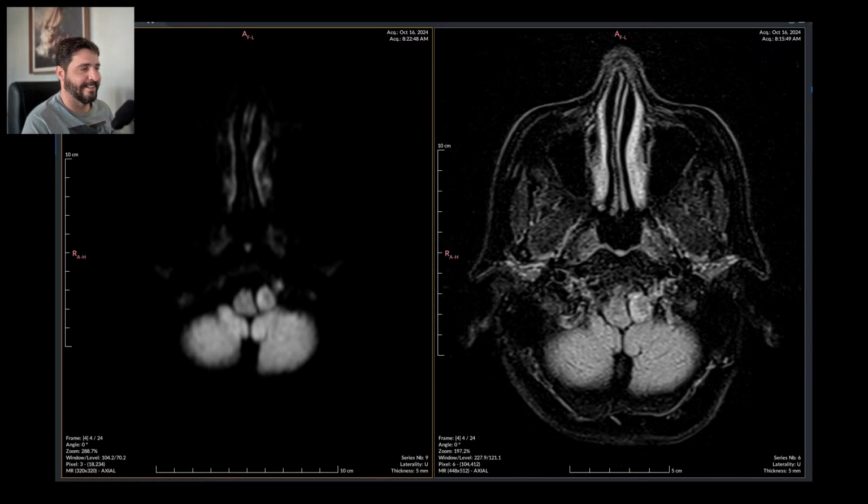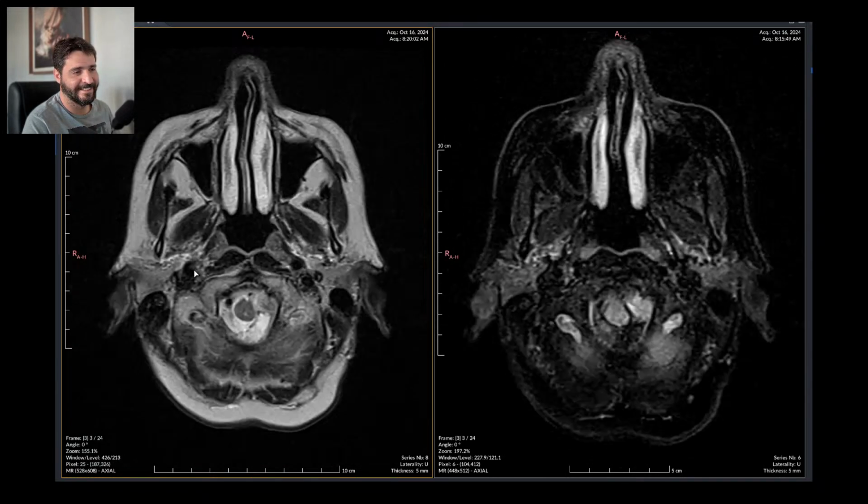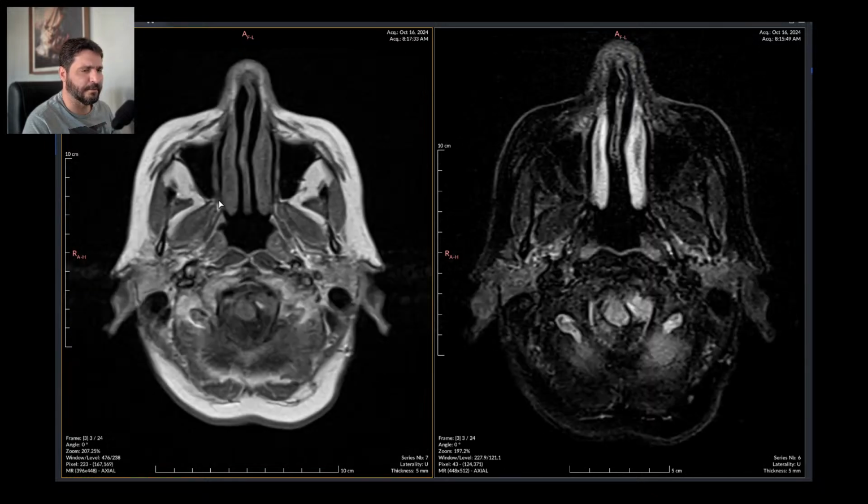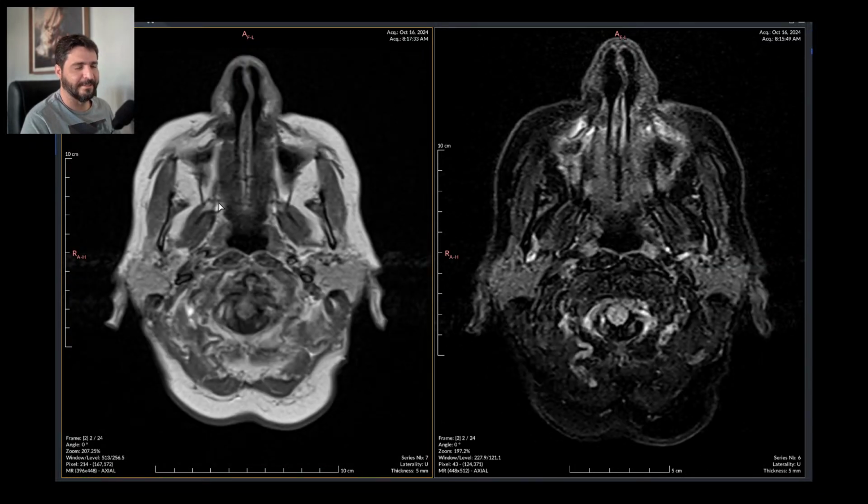Oh boy. Hey, there is something here. Check this out. It seems to be more than just flow artifacts. Really?